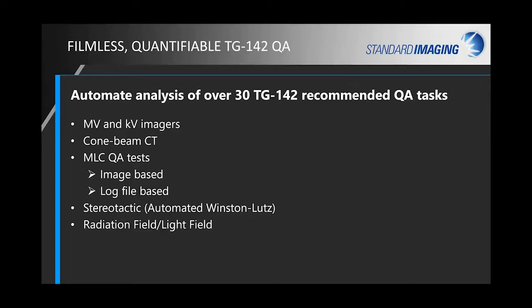Radiation light field coincidence test, starshot analysis, and we also have an IGRT database to keep track of your daily positions and shifts.